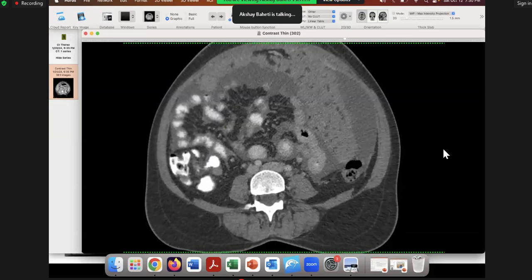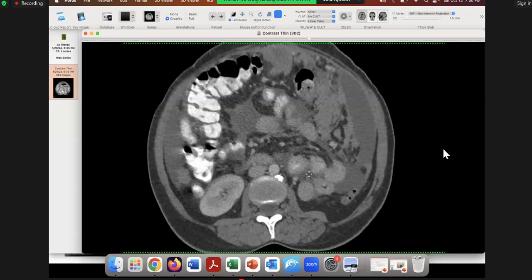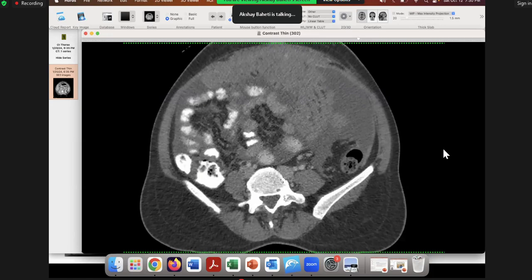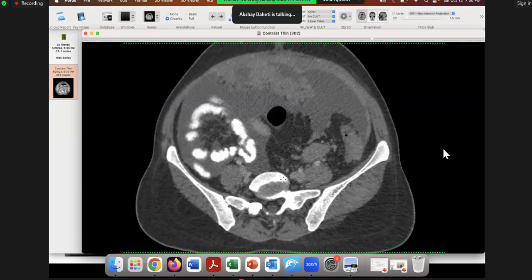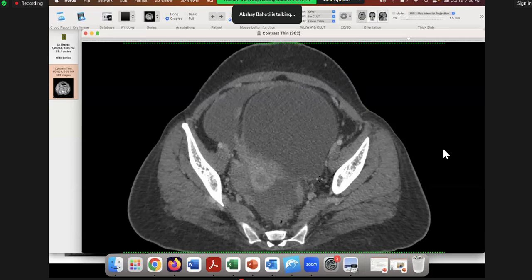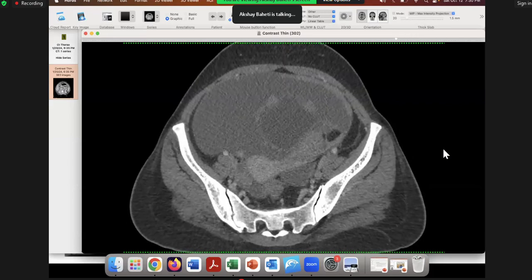Okay. So it's again not big, but given the extent of disease and given that internal mammary, it may be involved. So we don't know. Okay. But you can see here as well, right? You can see a common iliac here. So there are common iliac nodes. Definitely there are retroperitoneal nodes. I don't think there is anything in the pelvic side wall per se. I don't see any internal iliac adenopathy, or maybe there is something here, right? So we don't know. This may also be positive.